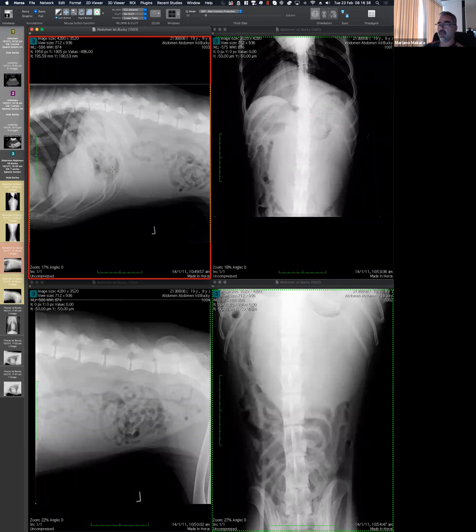Anytime we make the call about a mass, the next step is to see the pattern of displacement. Where is it originating? In which part of the abdomen, or the thorax? It works the same. And then how is that displacing stuff around? So your comment is very good. It's coming from the left, and it's where the spleen usually sits. The dorsal part of the spleen.